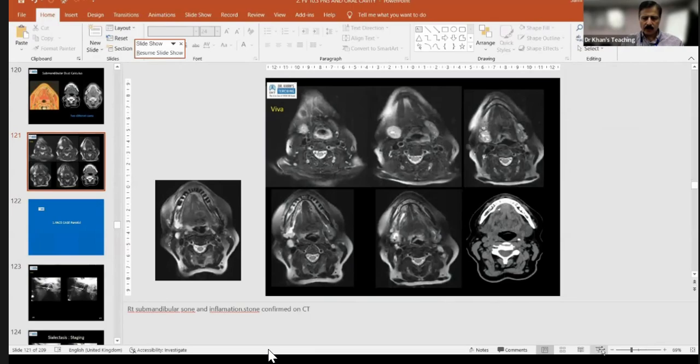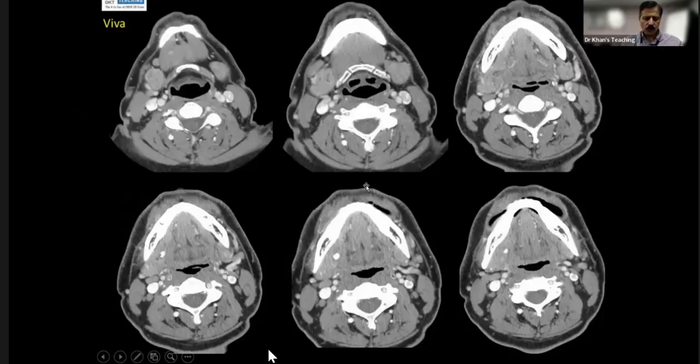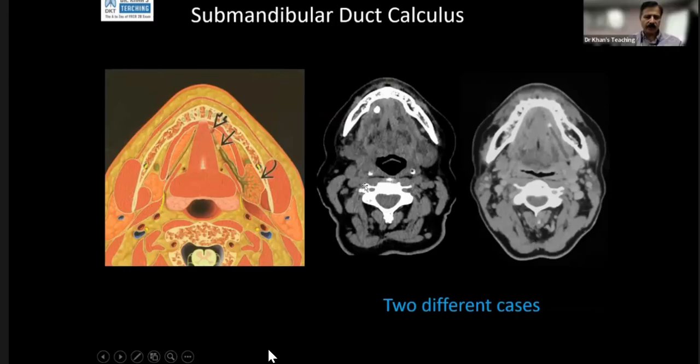So, candidate 2? Yes, sir. Correction, candidate 4. You can see my PowerPoint, submandibular duct calculus.